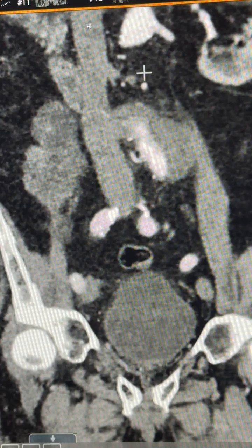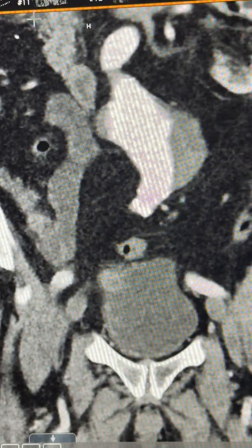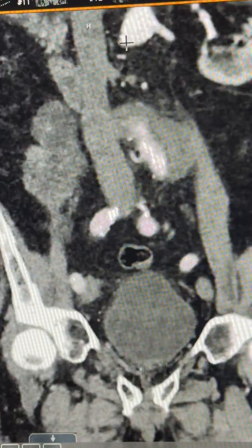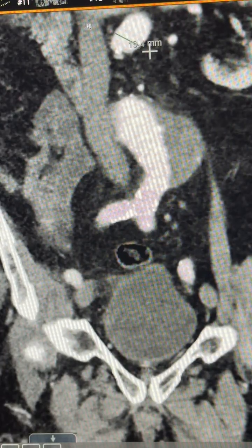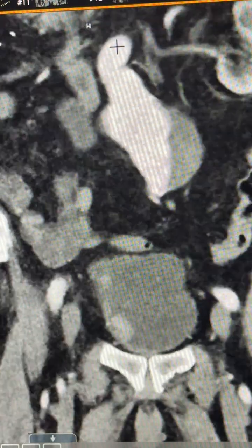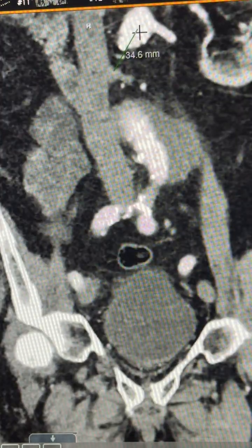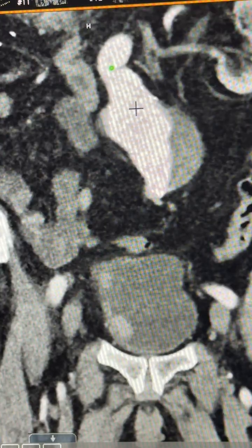So then once we're trying to figure out whether we can do this, because this gentleman showed up with a lot of pain at around 10 o'clock tonight. He has had an aneurysm before, but we've never measured it by CAT scan, and he has only one kidney. If you measure diameter there it's like 19, but that's not the way to measure it. You'd have to measure it using the true cross-sectional. But one thing we can do is get a sense from here to about there is 36, and then from here to here is another 26 to the end of the neck.